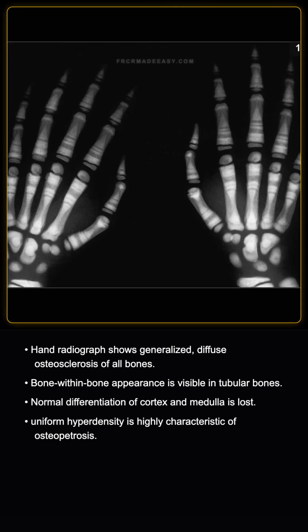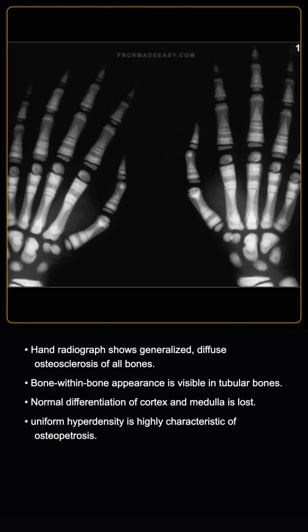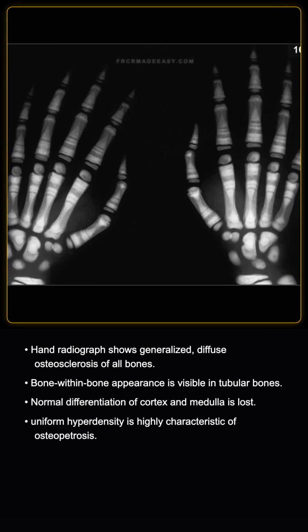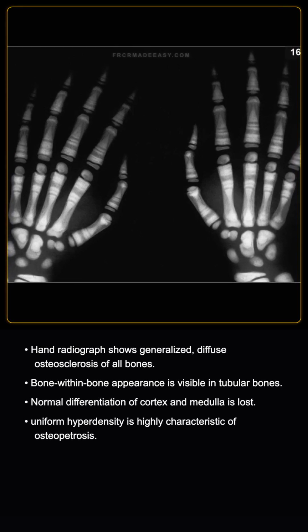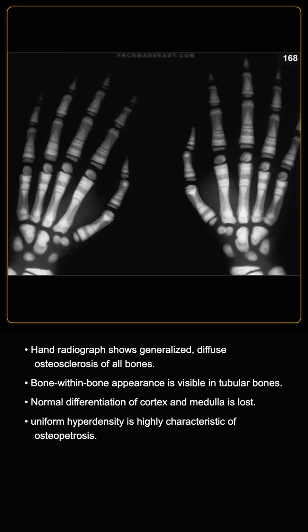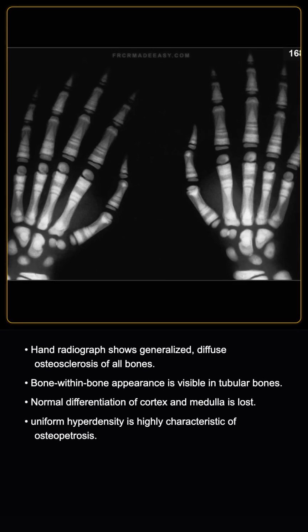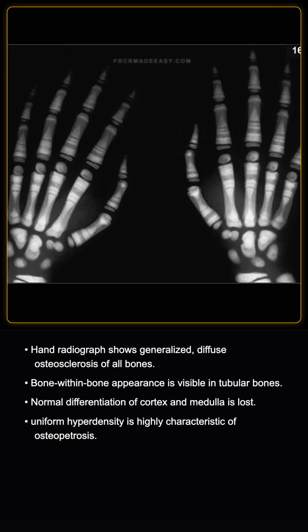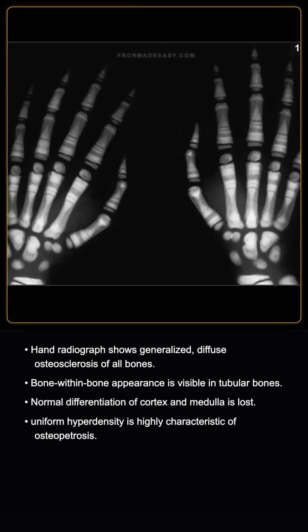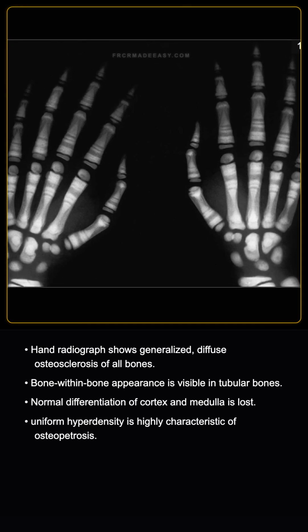The hand radiograph demonstrates generalized diffuse osteosclerosis affecting all visualized bones, including the carpals, metacarpals, and phalanges. There is a prominent bone-within-bone appearance, where a smaller, denser replica of each tubular bone is visible within the outer cortex. The normal differentiation between the medullary cavity and the cortex is lost, making all bones appear uniformly hyperdense. These features are highly characteristic of osteopetrosis.